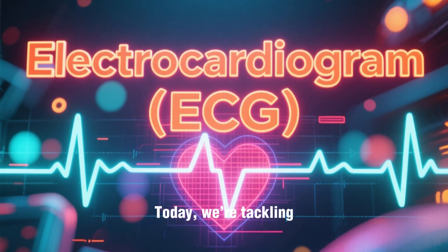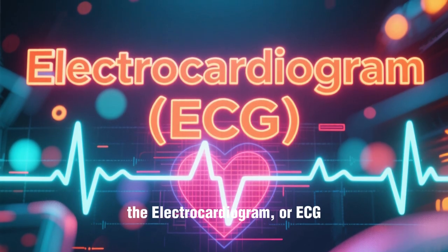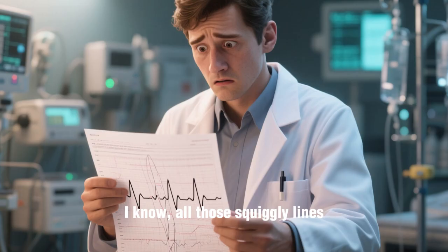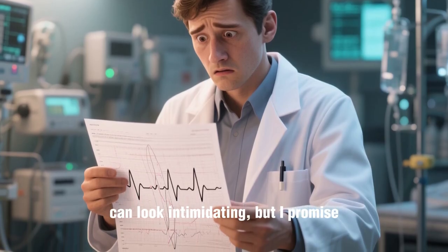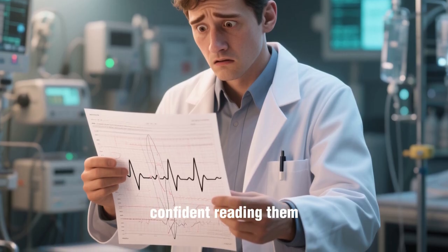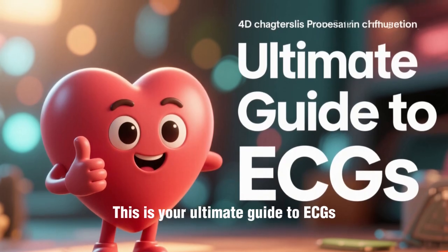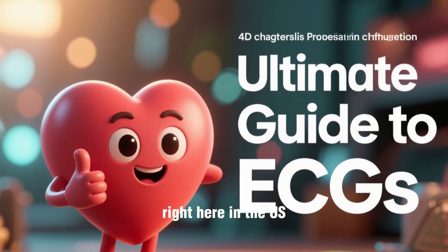Today, we're tackling a topic that can feel like learning a new language, the electrocardiogram, or ECG. I know, all those squiggly lines can look intimidating, but I promise, by the end of this video, you'll feel way more confident reading them. This is your ultimate guide to ECGs, made easy for MBBS and medical students right here in the US.